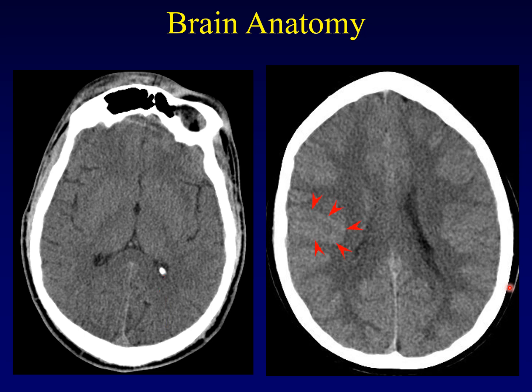Here I'm pointing to a brighter stripe, this sort of U-shaped thing right here. What is all of that? Well, that's the gray matter, right? And obviously, the designations gray matter and white matter were given by a pathologist doing gross specimens and not by a radiologist, because on a CT scan, the gray matter is whiter and the white matter is grayer, right?